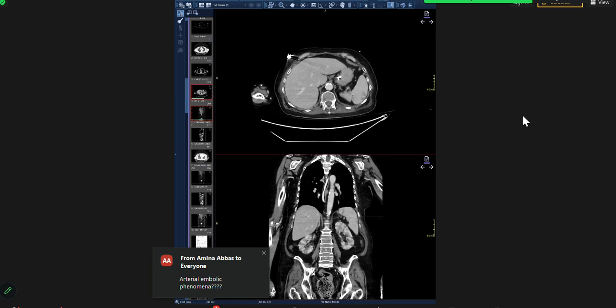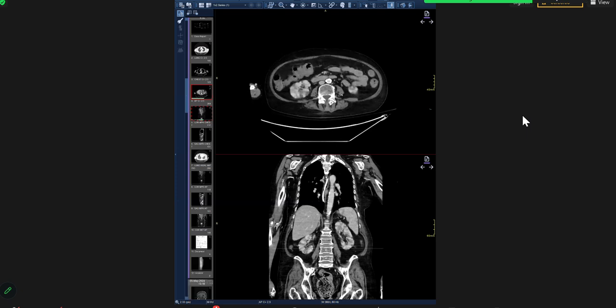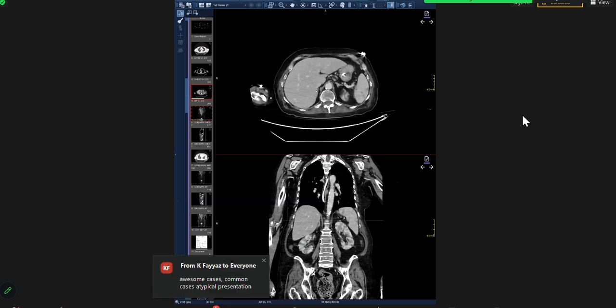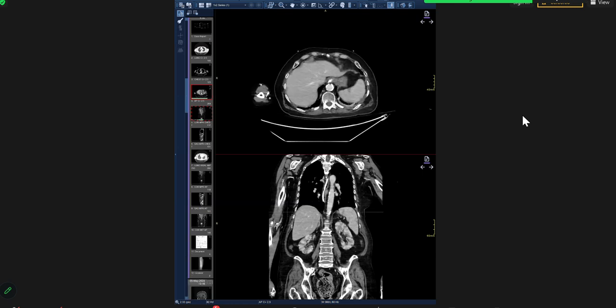So this is a thromboembolism, just clotting everywhere happening because the patient is hypercoagulable. That's why, and it's variable. Somebody can infarct the liver, somebody can do the spleen, somebody here he has the kidneys. She has the kidneys as well, and then she had in the brain as well.